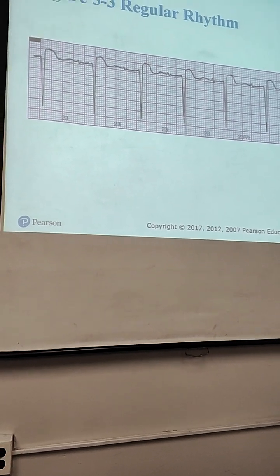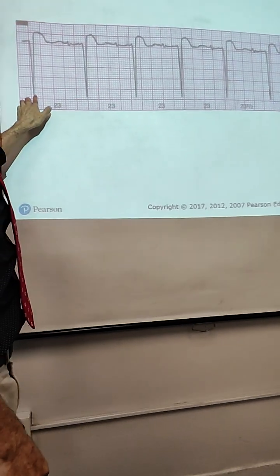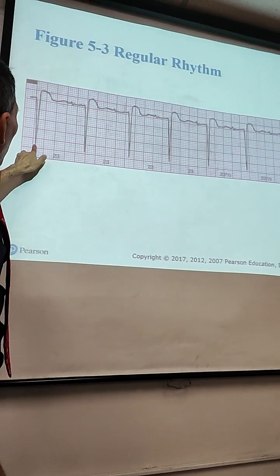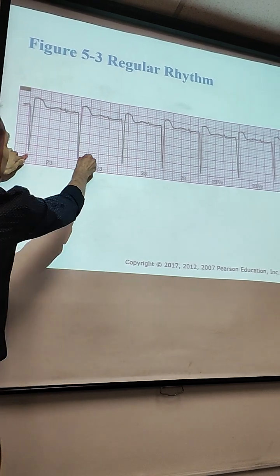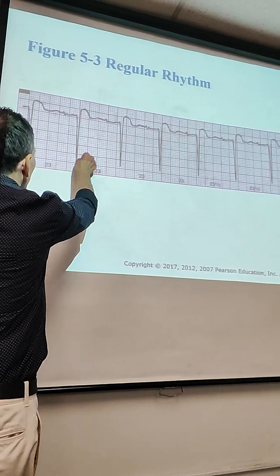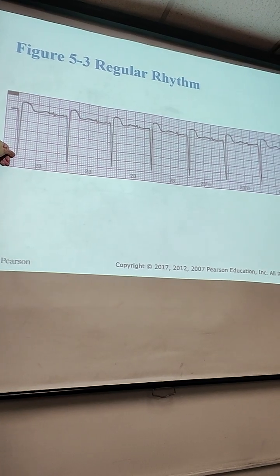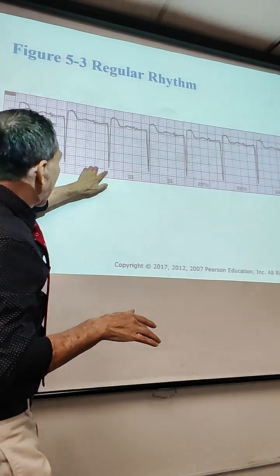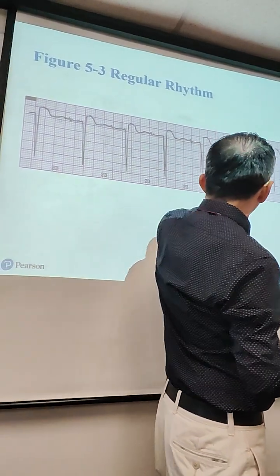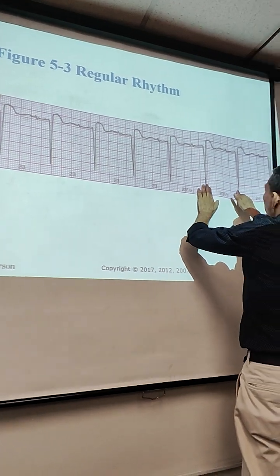So that's it. Now, if we're going to count here, is this from here to here 2 blocks? No, because this has to be right here on this line, and this on this line, for me to use the big blocks. I cannot have one little block off. Here, I don't have any of these. None of them meets the criteria of landing on one line.